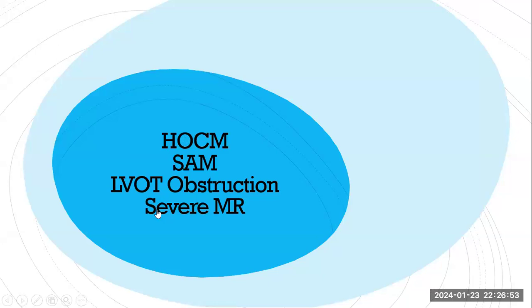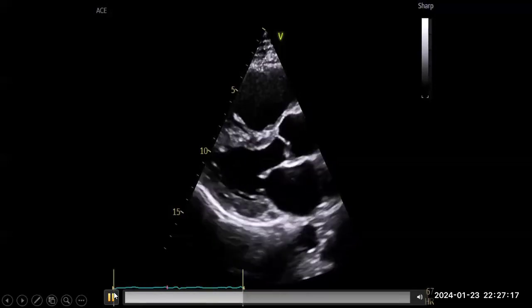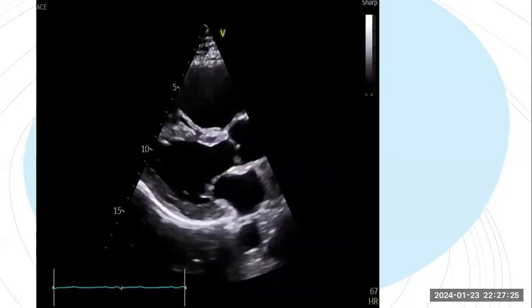Dr. Yasser, 2 questions, please. In regards to the mitral regurgitation, should we comment on it being mid-systolic, or the duration, with regard to the SAM? Is SAM always mid-systolic mitral regurgitation? Yeah, of course, it usually depends, sometimes, on the gradient that you will reach at the maximum. But yeah, likely this is coming before reaching the late systole. It's like mid systole. It could become late systole as well.